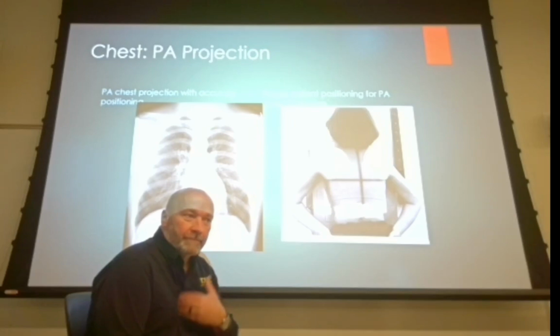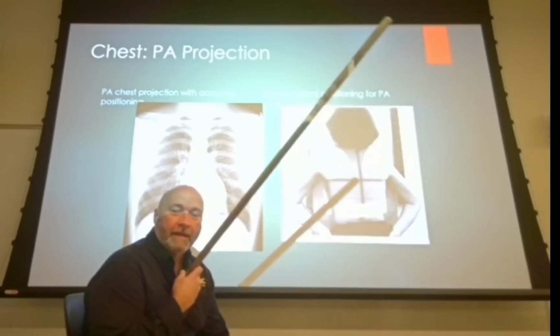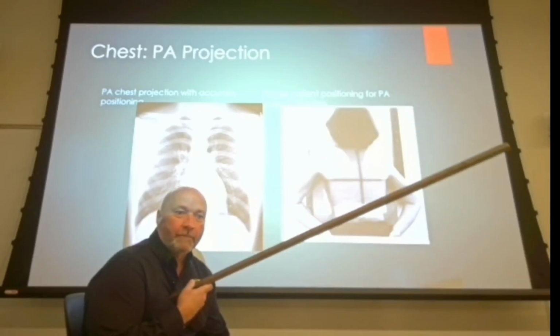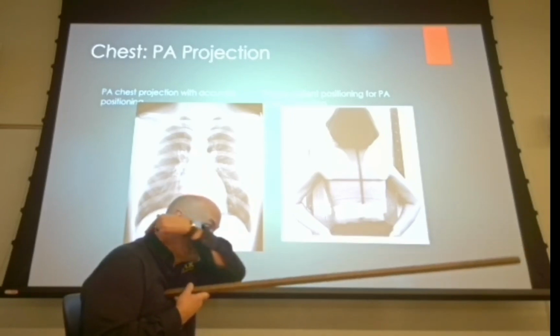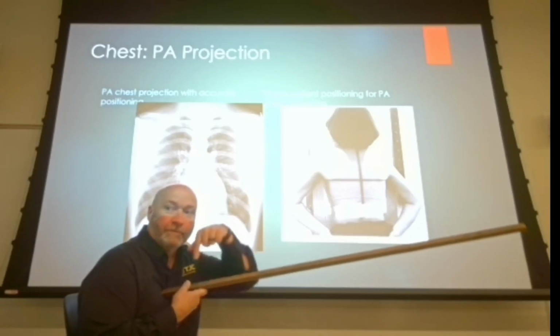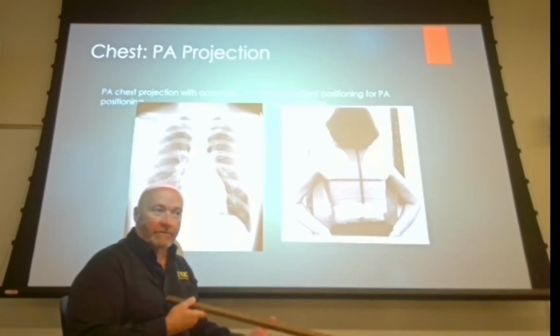then how's my sternum right now? Straight. It's pretty much straight up and down. If I angle 5 degrees caudad, what am I gonna show? It's gonna take the clavicles and, because they're further away from the image receptor, it's gonna push them further down into the thoracic cavity. So they're gonna get closer to the aortic arch, okay?